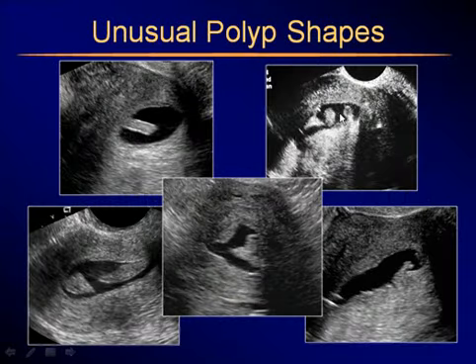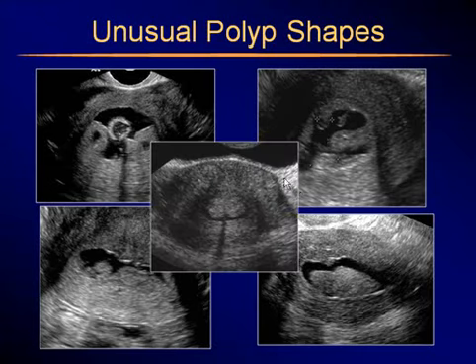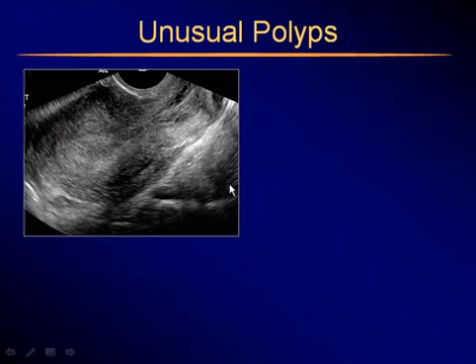Kind of tubular, here's triangular, rounded, elongated with sort of flattened borders. Here's a broad-based one, here's an odd-shaped one, another one that's shaped like a little hammer. So a variety of shapes. Here's some more unusual ones. Here's one with a cystic center. Here's kind of a bilobed. Here are several different, one patient with several different types and shapes, and kind of a bilobed shape here.